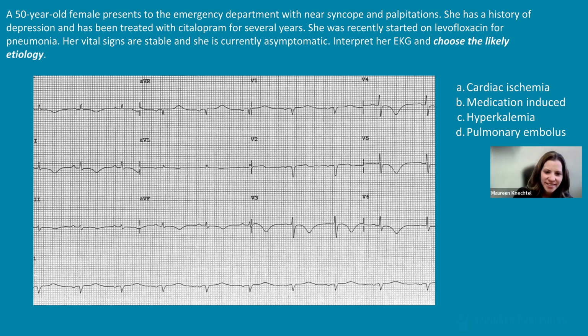this, but this is another one of the things that I would say is a can't miss. And no matter where you work, I think this is really important for primary care internal medicine providers to know about, because you're going to see these people on these really commonly used medications. And so this EKG shows QT prolongation.